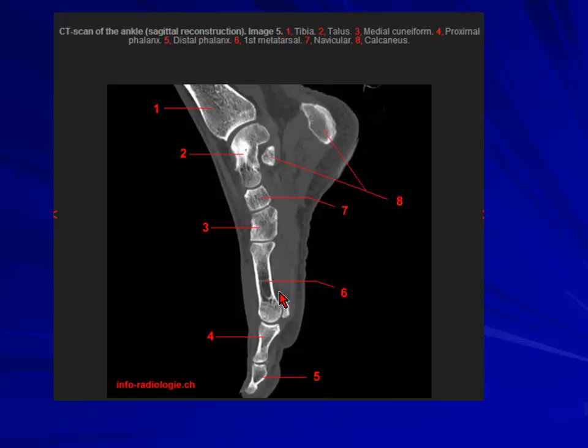and if they are obscured, we say stranding. So stranding terminology reflects there is some water, fluid, or inflammatory infiltrates within the soft tissue, and that reflects inflammation or infection. So when you are looking at this, somebody asked me, I don't remember who, if there is a joint which is inflamed or infected and there is loosening, how would you differentiate whether this is just loosening or this is infection?